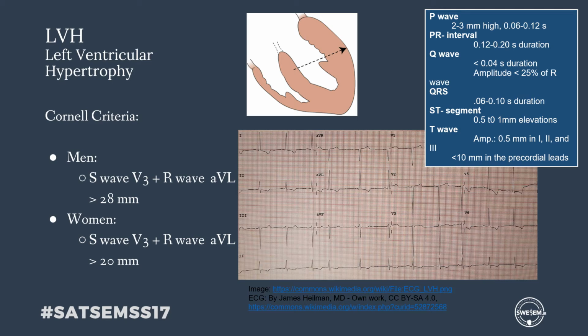This being the amplitude measured from the baseline to the R wave in AVL and from the baseline to the S wave in V3.